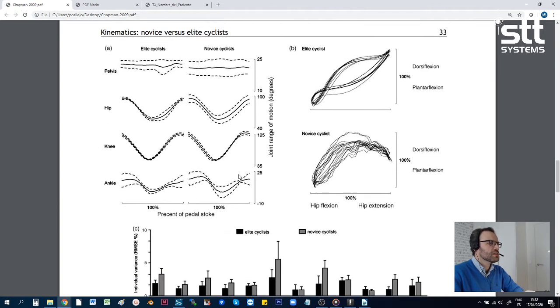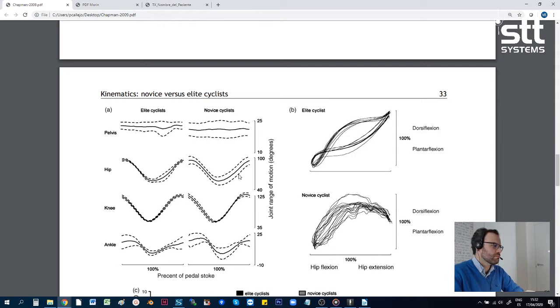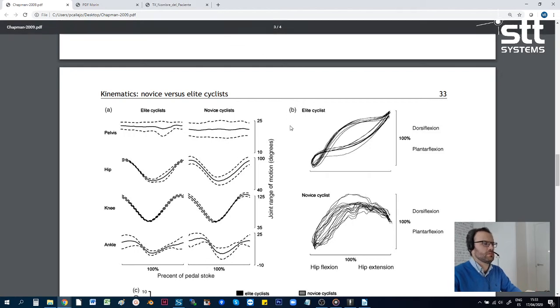Now, these all make sense because the lower limbs are not just one individual joint or a set of joints working individually. They are all working together, so it's a complex mechanism, and there are compensations going on in each leg on every cycle. Understanding how the full leg works and whether this combined operation is coordinated or not can be very insightful, especially for high-level athletes and scientists.